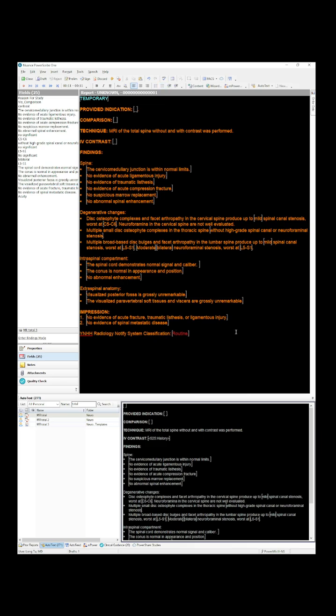And truthfully, this is not that good a template. This could be further improved. There are no pick lists involved. There are actually a couple, but there's a lot more that could be done to spruce this up. Sometimes I'll delete one of these lines, or I'll just delete and replace. But I found that trying to narrow what we do and what we talk about is pretty reasonable.